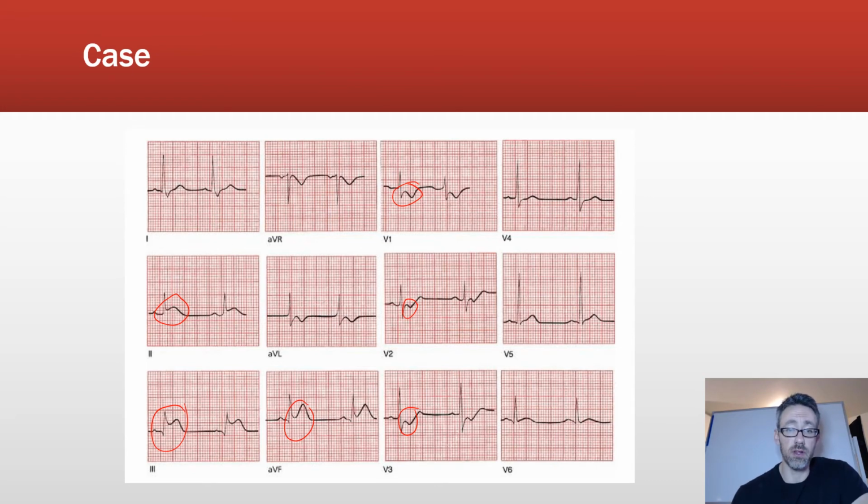Before I go any further, before I go into the ST segment depressions and whatnot, let's see if we have any Q waves that we can find as well. I can give you an example of that here, which naturally I don't see any right now. So no Q waves. And reminder, the Q waves are going to be representative of usually an old infarct, since Q waves typically persist for the life of the patient. So it gives you an idea if they've had infarcts in the past.